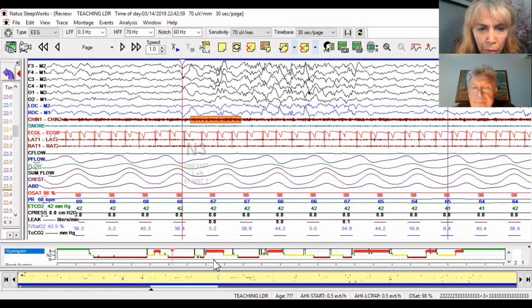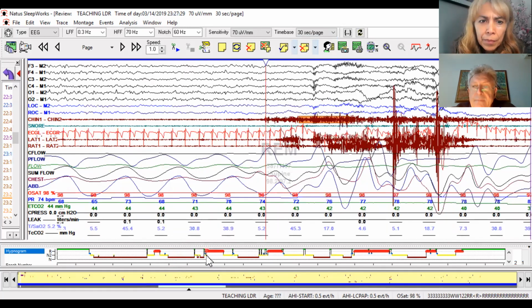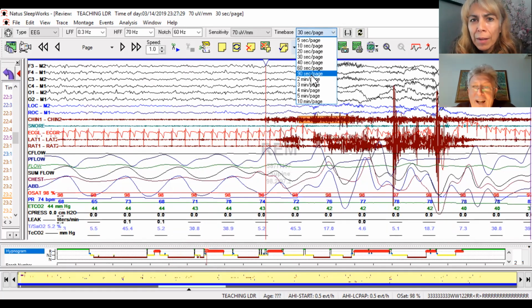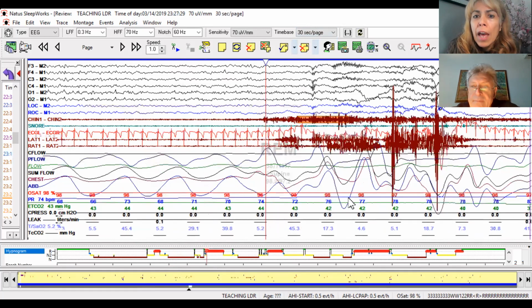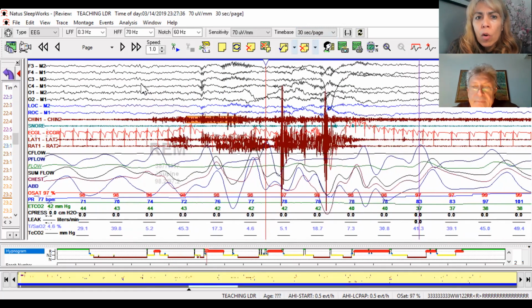Let me move to REM sleep to see if we see something. I just jumped to a REM epoch. So then we can do a couple of scoring to REM, and then maybe that will be it for this first session. And here's our first one. Yeah. No doubt about this movement. So very important to know that we have seen the large muscle groups in REM. And I just want to clarify the whole muscle group, maybe I will let you clarify, Dr. Ferri, because some of the questions, which I had when we wrote the first paper, is this going to be REM without atonia just because we see these movements?